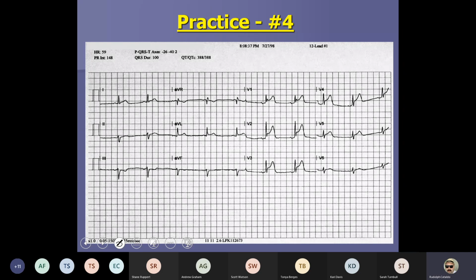Oh, here's a good one. All right, Cassie, I want you to tell me specifically, I have just one simple question. I'm not going to ask you to identify anything on this 12 lead. I want you to tell me what the axis deviation is of this 12 lead. Oh, this is the thumb thing, isn't it? Yes. Oh, and I got it wrong last time we did it. That's why we're doing it again. Okay, left thumb is what lead?